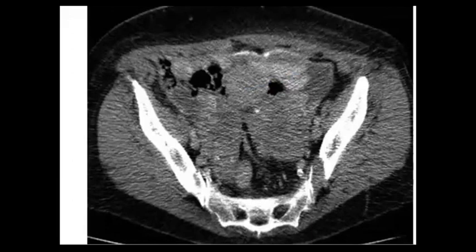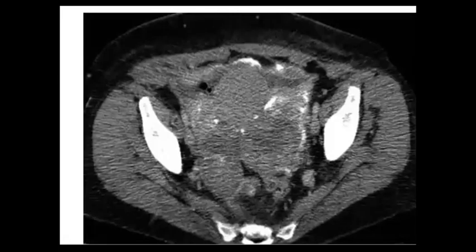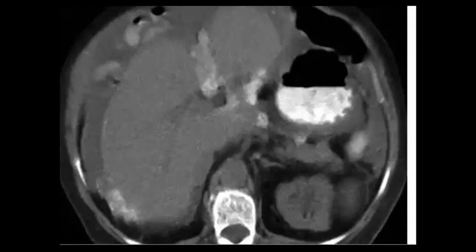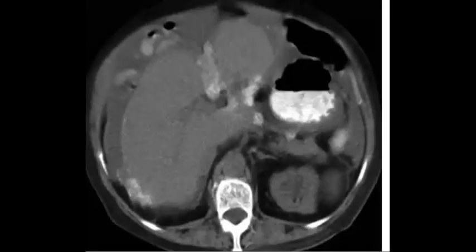Dipthic Ashok. Nice, thank you. So there are ovarian adnexal lesions. Yes. Bilateral ovarian lesions. Perfect. Maybe more obvious here. So bilateral adnexal masses. I will not go to the diagnosis now. I want to check first the description, because I think if you go with this approach, you'll miss many marks. It's better to describe.